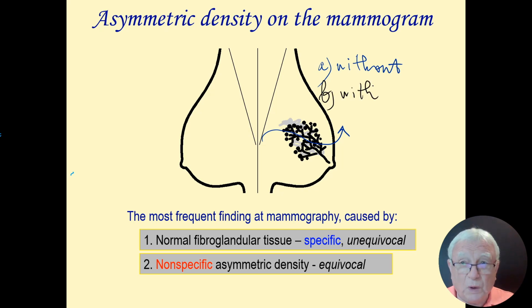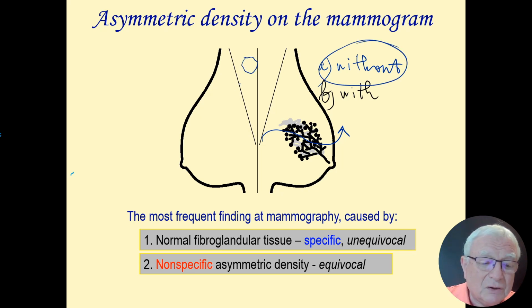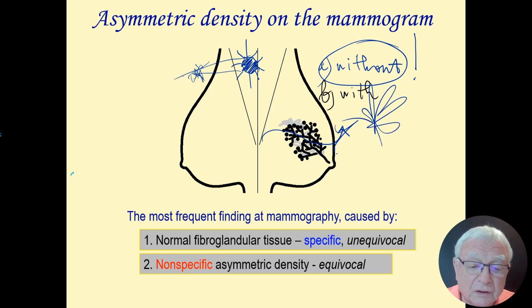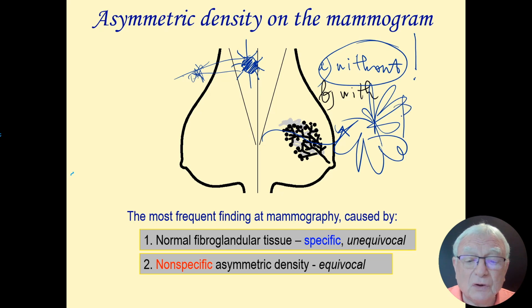What do you think? Which one is responsible for most of the mistakes radiologists are making? This one. The stellate lesion, when it measures about 10, 15 millimeter, has a nice central tumor mass, straight spiculations, yes. But when it's a baby, then it's just a smudge without architectural distortion. And that's where most of the mistakes are. That is, we miss cancers. That's what is difficult. Architectural distortion, yeah, it's difficult when concerning perception.